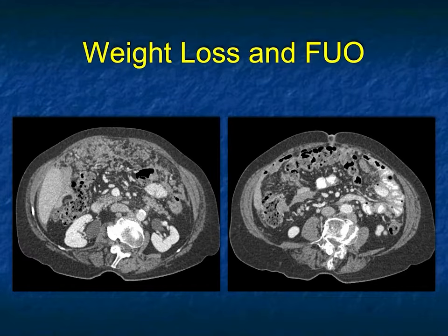This patient has weight loss and fever. When you look at the images, what I see most is this pattern which looks to me like carcinomatosis on the omentum. When I see carcinomatosis, I think about, well, if it's a female, especially ovarian cancer. It could be a mesothelioma, could be gastric cancer, could be colon cancer.